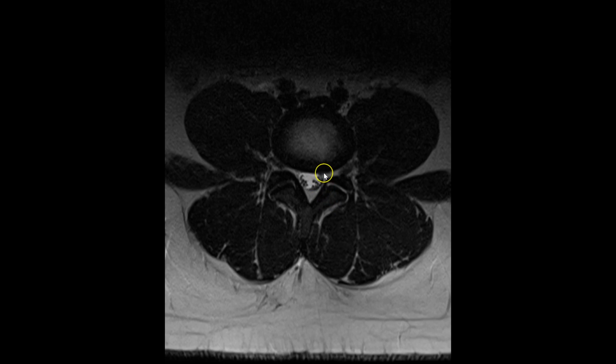I want to remind you it's usually the surrounding inflammation by a disc herniation that causes neuritis and pain, whereas it's the compression of the nerve root that will cause focal deficits such as weakness and/or sensory deficit, numbness, and tingling. So it's important we refresh a little bit of the somatotopic anatomy or organization of the cauda equina nerve roots. I'll remind you they're arranged front to back in an organized fashion. So for example, this will be the L3 nerve root here, then the L4 in the back, L5, etc. That's why you need a quite large disc herniation to compress the S2 through 4 nerve roots to produce the clinical syndrome of cauda equina syndrome, because those nerve roots are protected dependently in the back of the thecal sac.